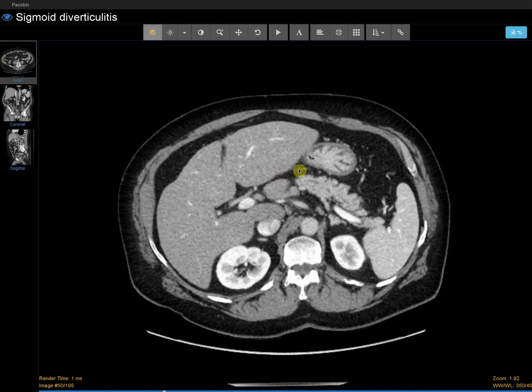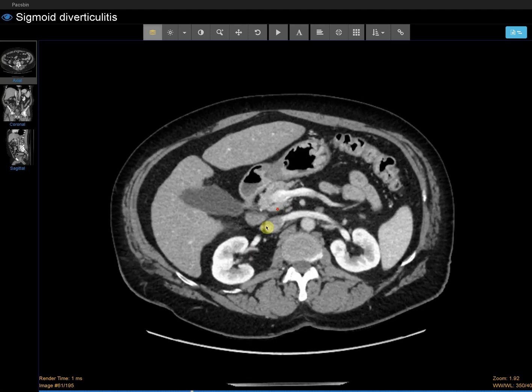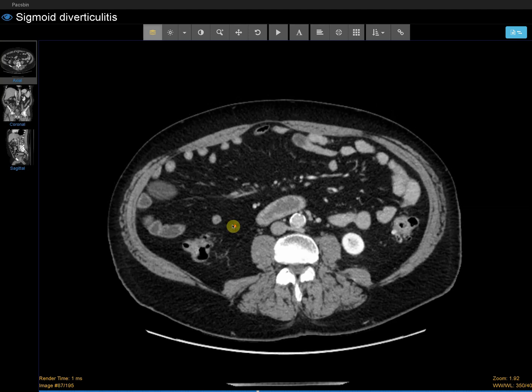Again, one of the things we talk about in abdomen pelvis CT is inflammatory fatty stranding, which is anytime there's an inflammation in the organ, the fat around it tends to be more dense because of water in it. The fat around the pancreas looks pretty good. So pancreas looks good. I look at the kidney and then I quickly go down.